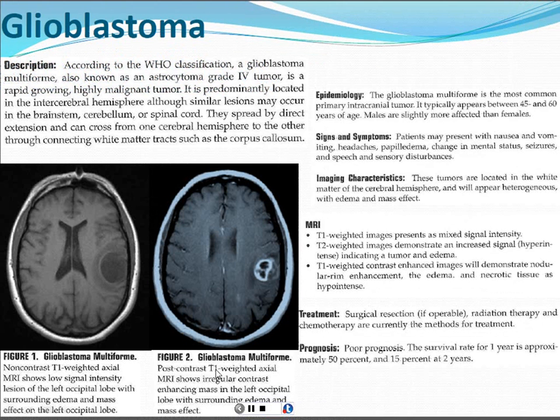This is a glioblastoma. It's a type of astrocytoma, really the most aggressive type of astrocytoma. It's a very, very rapidly growing, very aggressive tumor, unfortunately. Many times the patients will present with a seizure or something like that, kind of a dramatic presentation. You don't usually have one of those for very long before you know it. They get large quickly, and the notable thing about them is they induce a lot of edema.